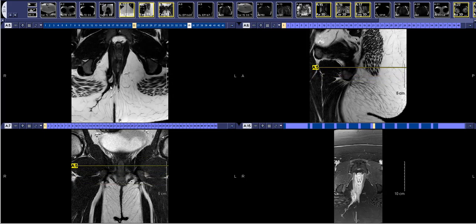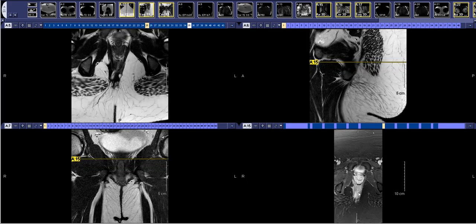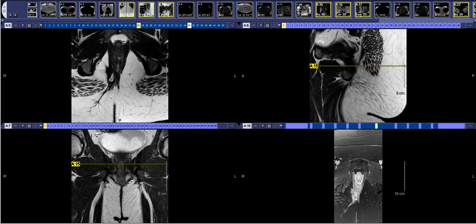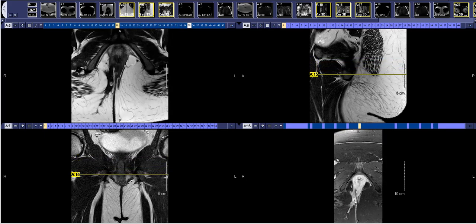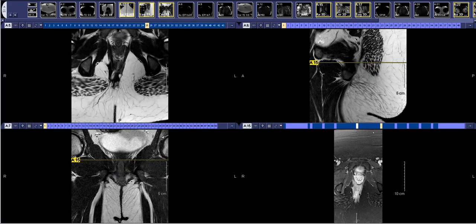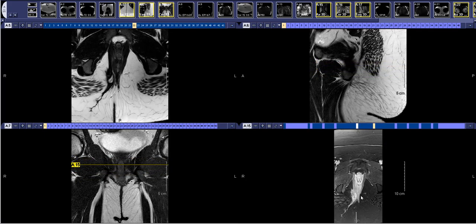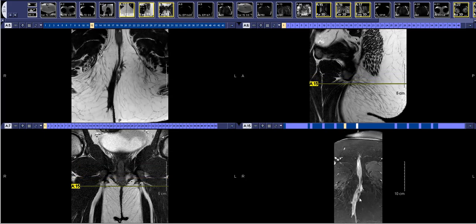So this one you can also see on the T1 post-contrast. You can see it pretty well. You can see there's some non-enhancing soft tissue in the middle, so there's a little bit of fluid or pus in there, and that also convinces you that it's still a patent fistula. And this one doesn't have anything like that, so this is a chronic fistula on the left.